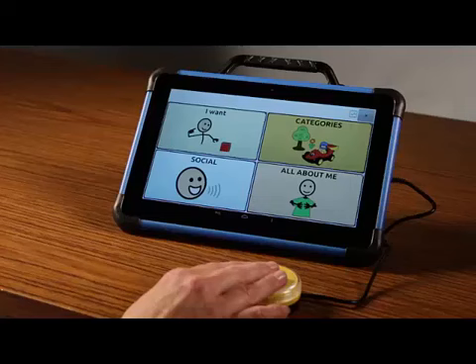The active area is magnified as it moves through the scan pattern. You can select the percentage under Magnify Multiplier. The vocabulary scanning pattern will also impact how the magnification appears. For example, in block scanning, if the magnification is large, the group of buttons will be stacked. It is possible to magnify to fill the entire screen with one button. This example will be with 4 basic and a linear pattern.